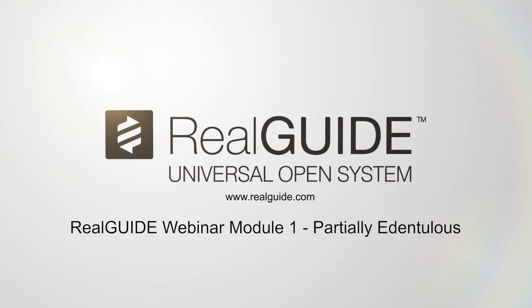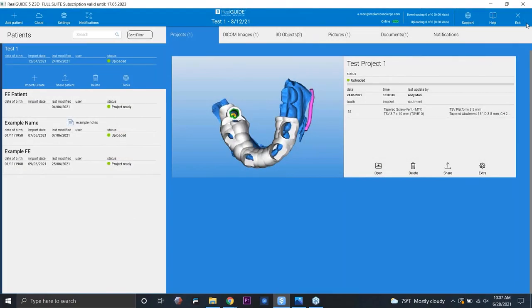All right, so without further ado, let's go ahead and jump into today's agenda for the RealGUIDE software. So of course, RealGUIDE is a treatment planning software with design capabilities as well. And what makes it a truly powerful and really exciting software is how comprehensive it is. At the base level, it's a free treatment planning software, which is great. It's accessible to everyone for no cost for you to go ahead and import your files and work up your implant cases and create those virtual implant treatment plans.